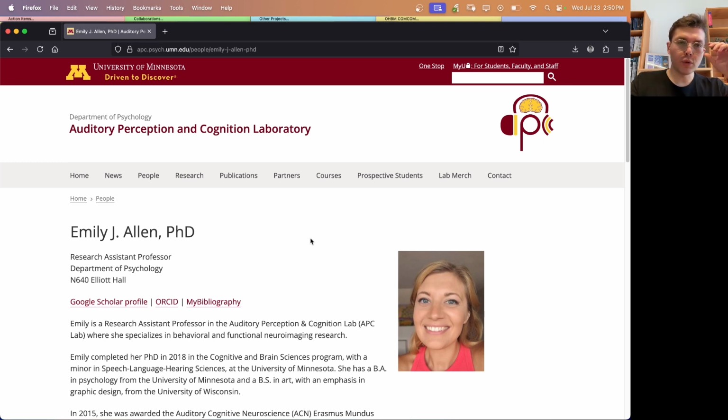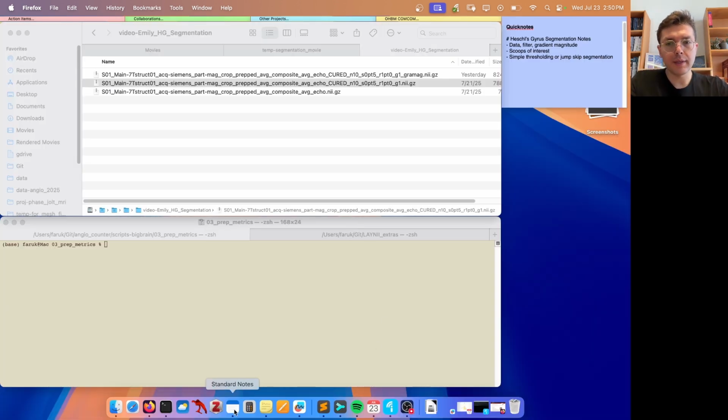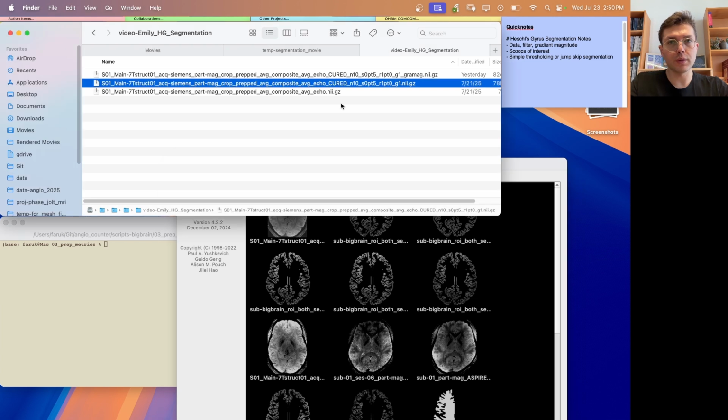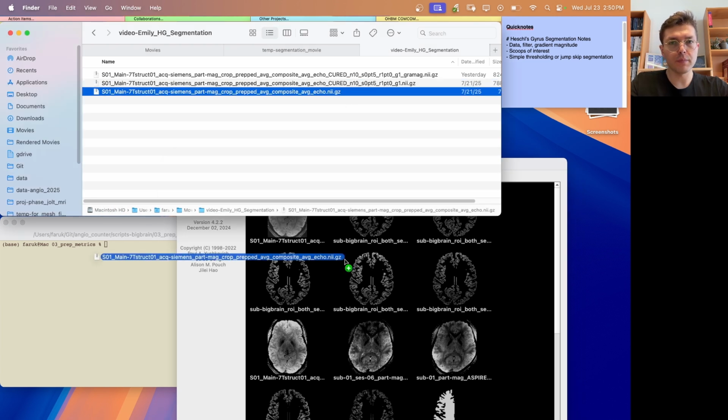And in this video, I'm going to show her how I would segment the Heschl's gyrus, only Heschl's gyrus, based on very high resolution 0.35mm GRE data. Okay, so let's have a look at the data first. In ITK Snap, I'm going to introduce the images that we have.